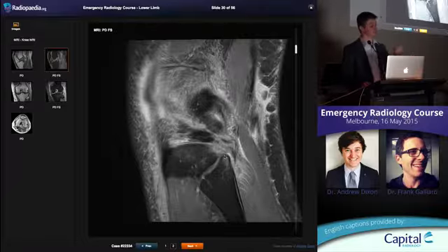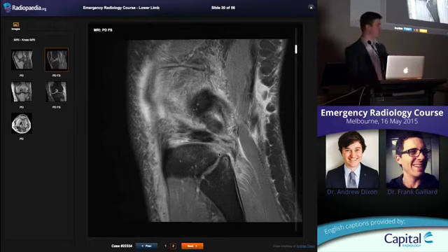Okay, so spotting that Segond fracture on the plain film, very important. If there's an injury at the posterolateral corner in a patient who needs an ACL repair, that often is important to recognise because they need to repair that posterolateral corner as well. Otherwise, they get graft dysfunction from their ACL repair. But from your point of view, looking for those tiny little avulsion fractures, small but very important.